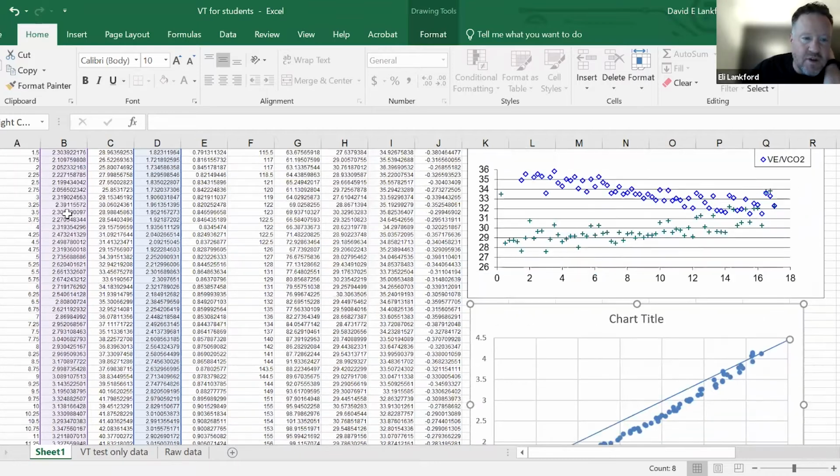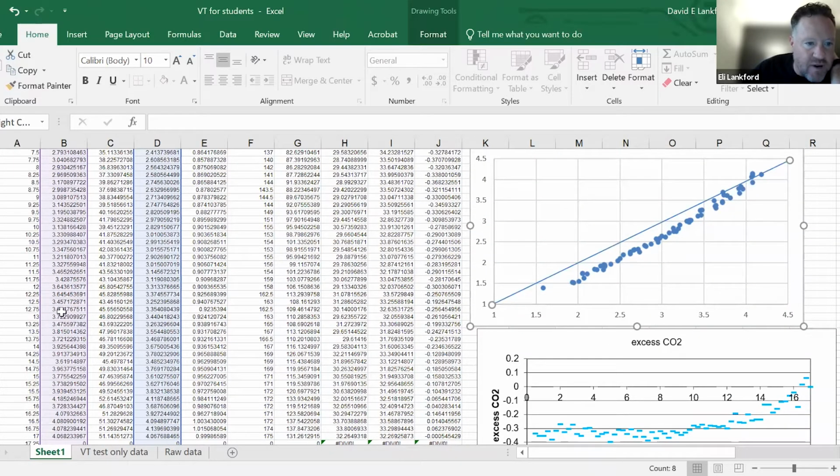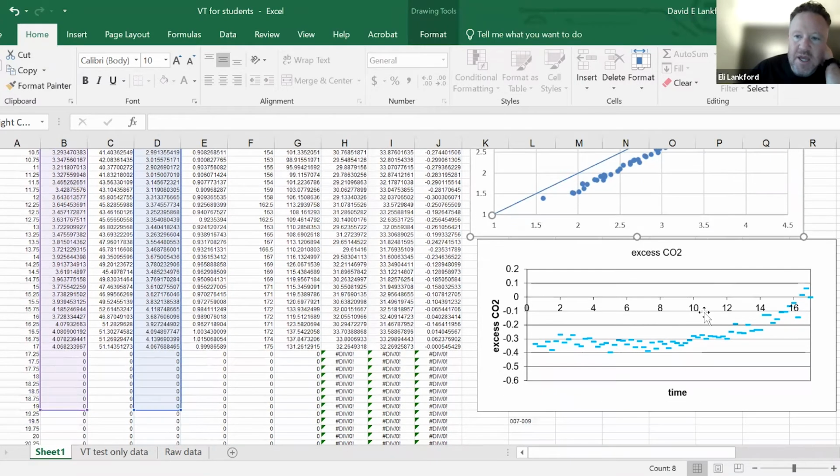So I'm going to come over to the VO2. When do we start to see us at 3.5? Well, how about that? 3.3, 3.4, 3.4. And then here we go. Around minute 12 is when we finally hit that 3.5 mark. The same thing here, look at that. Minute 12 is when it really all of a sudden started to climb up from there.